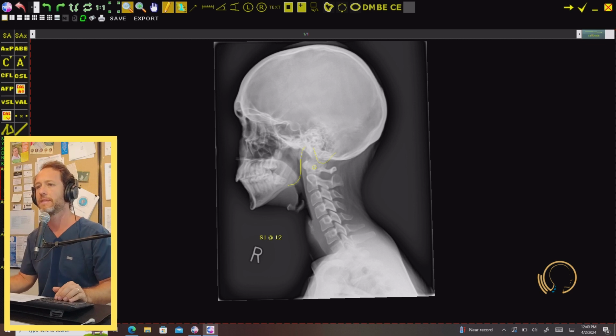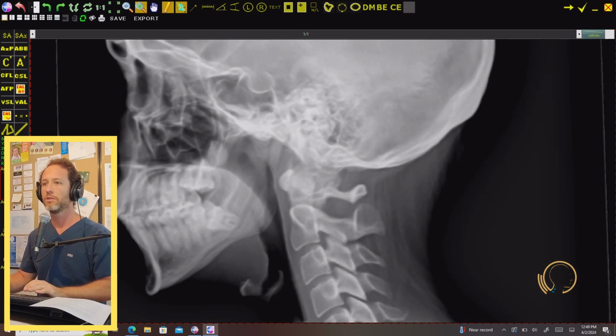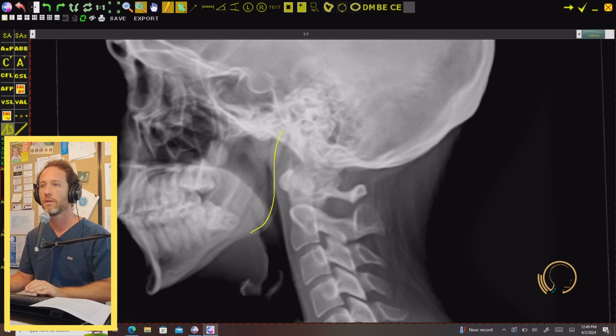In terms of, is this a clean view or not? And I'll take some of this off. This is already one that's been analyzed, but we'll pretend it hasn't been, right? You should have rami, right? You'll see those jaw lines should be superimposed. This isn't the best example, but that rami, if I'm kind of dropping this line here, you should want to see those as close as superimposed, both, that aspect of it, and then also down here, right? You want to see one right on top of the other. You do have 2 slightly visible.